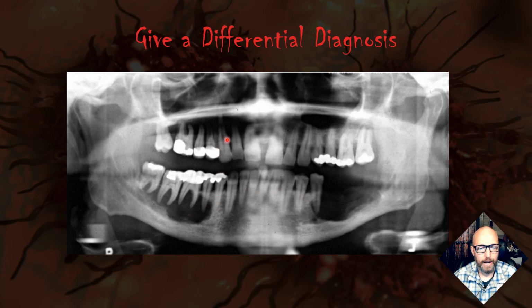And also they don't have as severe periodontitis in many of these areas. Another scooped out appearance on this side, very destructive through here. Even with severe periodontitis, you don't expect to see this amount of bone destruction. So bad sign. And Langerhans cell histiocytosis is one of the ones that I say to remember develops around the roots of the teeth.